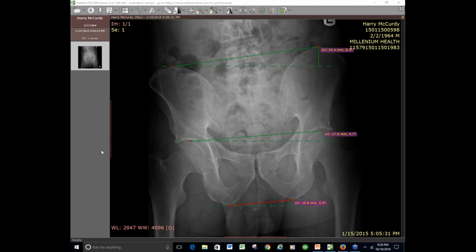I know that that's got to raise some questions. So give them to me if you have them. All right, here we go. I'm going to go with Marion. Would you please raise the ischium so it becomes 8.2 degrees again?